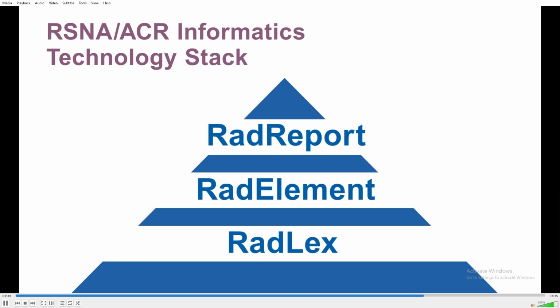Also note that although the AI algorithm identified multiple findings that were presented to the radiologist on PACS, only a subset of those mapped into the final report and presented to the ordering physician in the report, according to the specifications provided by radelement.org Common Data Elements.